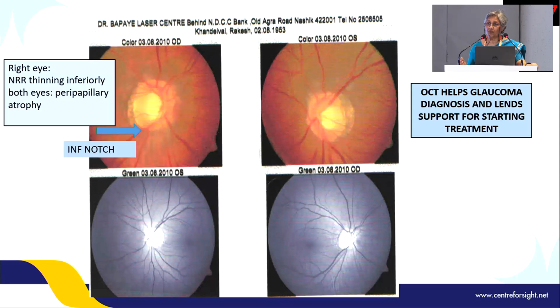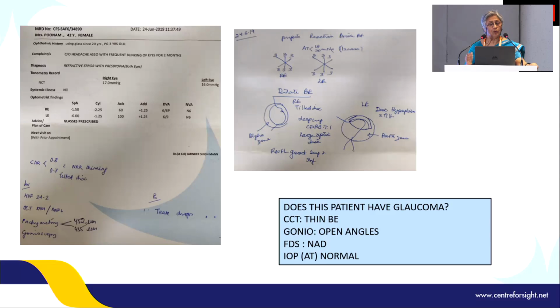It helps the glaucoma specialist with diagnosing. It also lends support to us to start our treatment. We go to a second case.